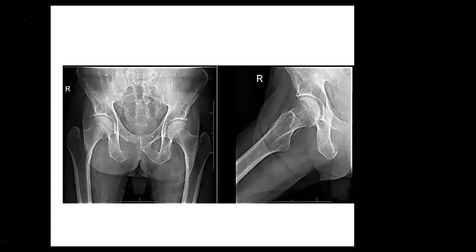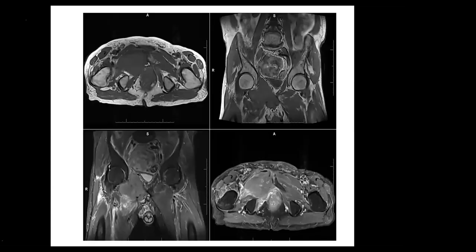No obvious periosteal reaction. So I recommend doing MRI. So multiple section MRI. There is an extensive soft tissue density lesion, isointense, seen involving the inferior pubic ramus with soft tissue extension into the pelvis, showing aggressive enhancements after contrast.